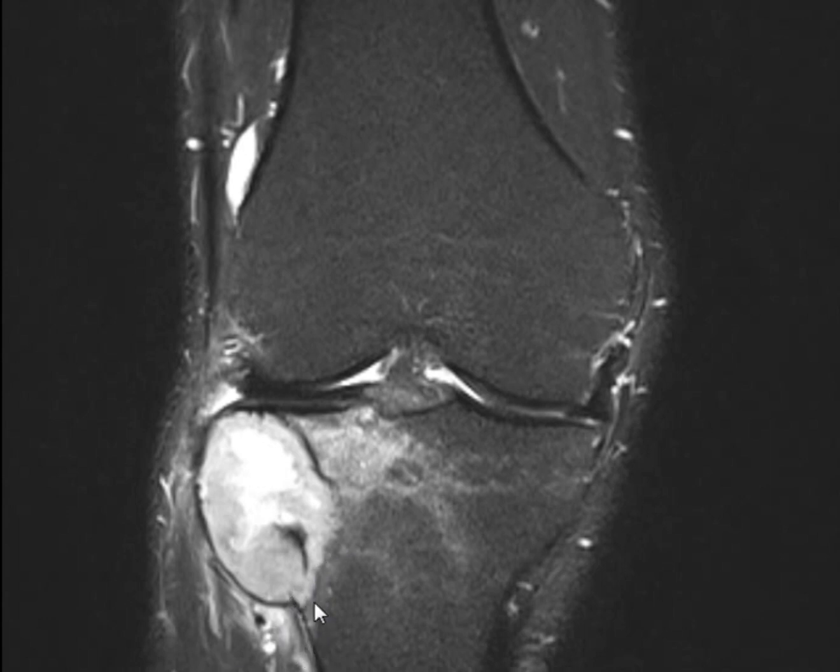First, when you see a bone tumor, where is it located? Located in upper tibia. Metaphysis reaching the epiphysis. What else? Not causing cortical destruction. So it's expansile or not expansile? Expansile. Most important thing when you see a lesion in the upper or the end of the bone is to say what?